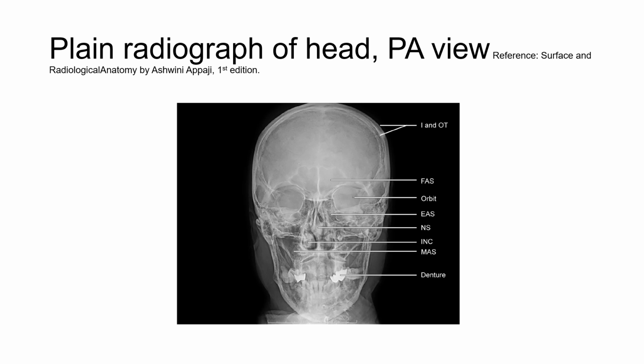Now what are the radiolucent shadows? What do you mean by radiopaque shadows? It means the bones will look white on X-ray. And radiolucent shadows are the air filled cavities and tubes, which will be seen dark or black on X-ray. Which are the air filled cavities?